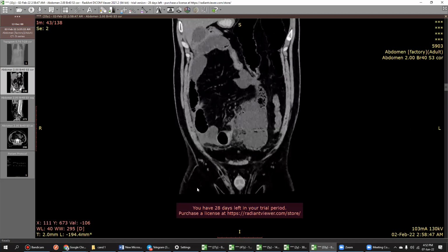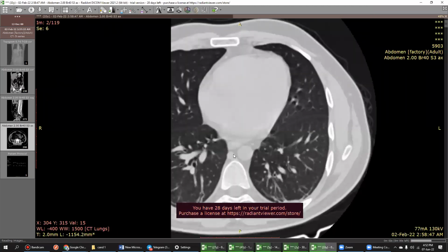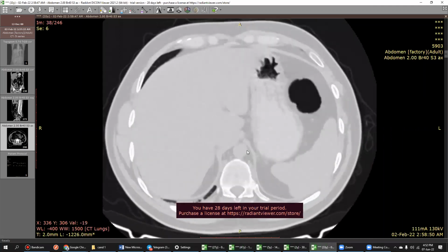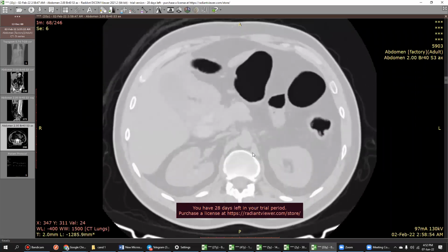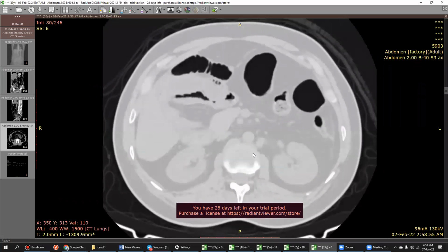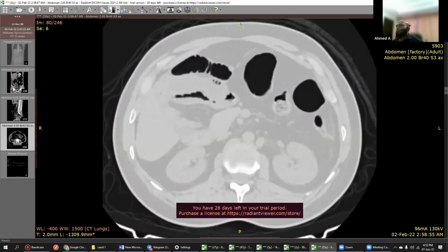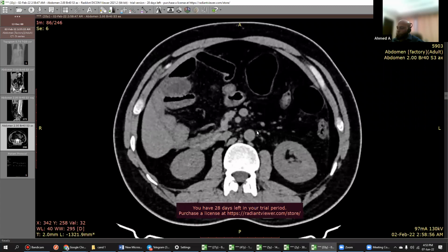What do you want to look at on the axial? So basically, I will be looking for tracing the duodenum, whether it is crossing normally or not, which I believe it is not. So I need to see it. You can change the window, it'll help. Just a second. And what else do you look for?